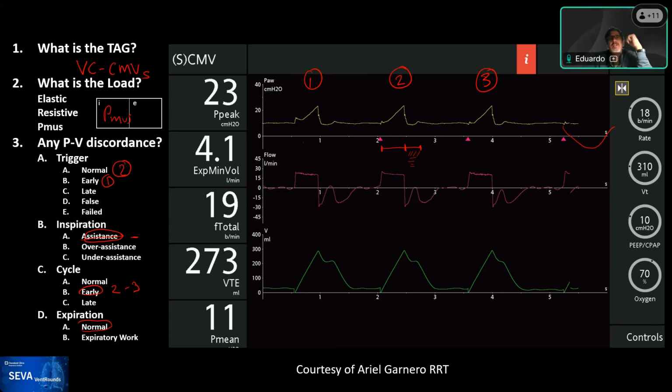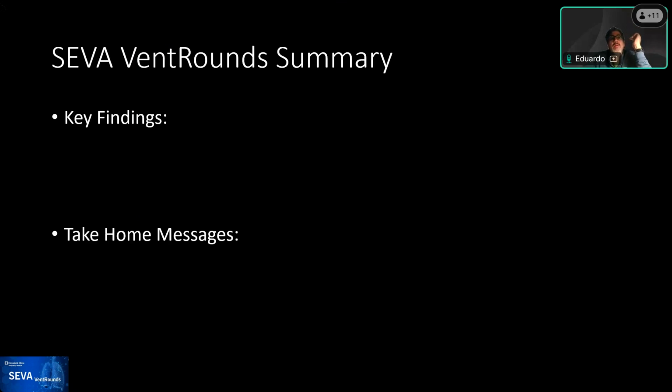So this patient, just for the sake of what was changed to pressure support, the goal was eventually comfort. You can see that the oxygen levels are going down. The patient got a procedure done, improved, and eventually got weaned off pressure support. So I would say today you have reviewed the full equation of motion in one single case. And I love when one case can show everything.